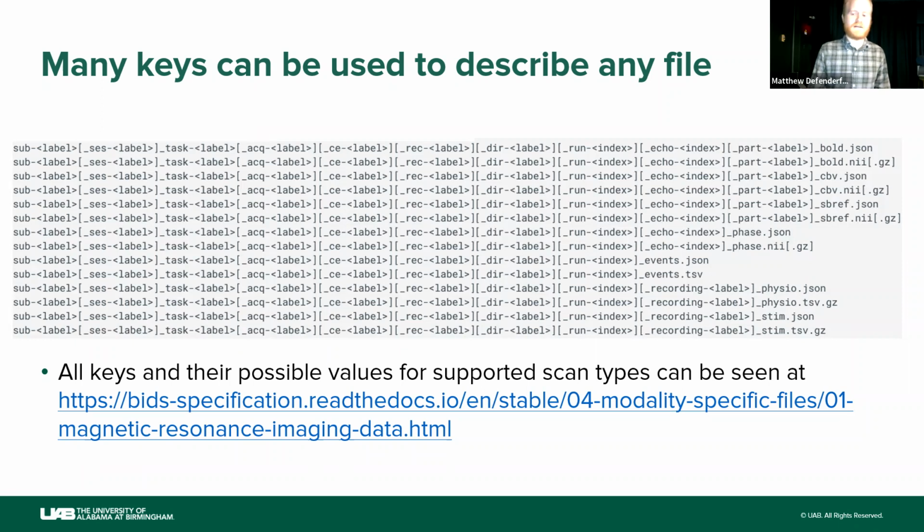Basically, there's not a way to say, here's a master TSV for all of these runs of the exact same scan. You need to associate essentially identical TSVs to each of the functional scans. So the sub and ses do need to reflect their respective subfolder. Yes, they must reflect the respective subfolder. So anything labeled with sub S01 is only associated with subject S01. And you need to change that label every time that you copy it to a new subject.